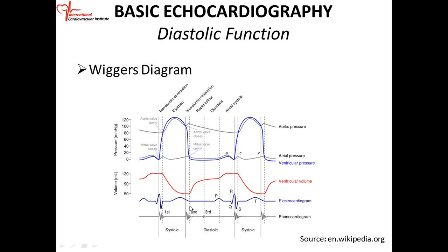If you look on top of that, that's the EKG or the ECG, okay? Remember, I always tell you, systole is from the beginning of the QRS to the end of the T wave, and that corresponds to the phonocardiogram. When you listen, it corresponds. Systole is from the beginning of the QRS to the end of the T wave, and then diastole is from the end of the T wave to the beginning of the QRS. So it matches up.